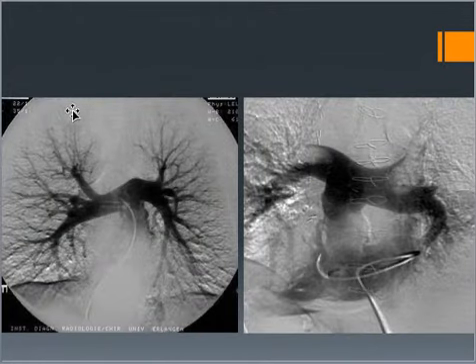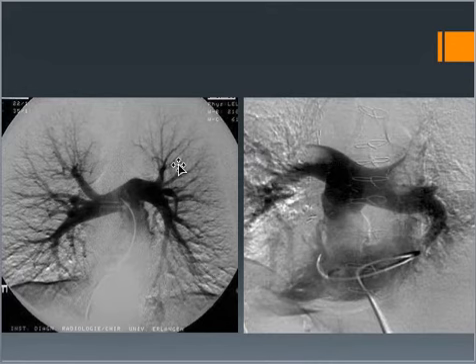Look at all of the vessels in the lungs on the normal one. I love these. They kind of remind me of tree branches. And then here you've got it all pooling because there's a blockage.